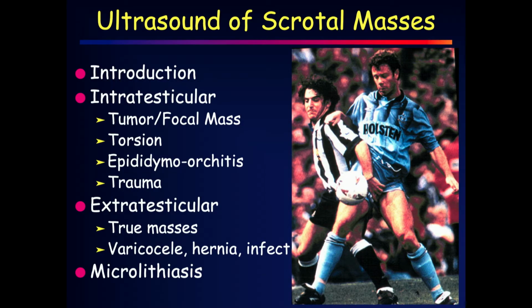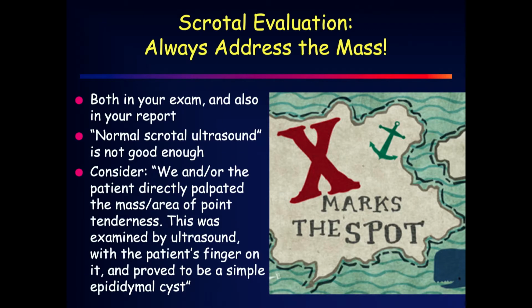So this talk is going to be liberally illustrated from my journal of choice, Sports Illustrated. You can see the structure of the talk, introduction, intratesticular, extra-testicular there. This is the very first ultrasound ever published by Fred Sample. It's bistable, black and white. He was showing a hematocele, and you think how blessed we are with the hardware and the software that the manufacturers are giving us now, and we can see unbelievable things.